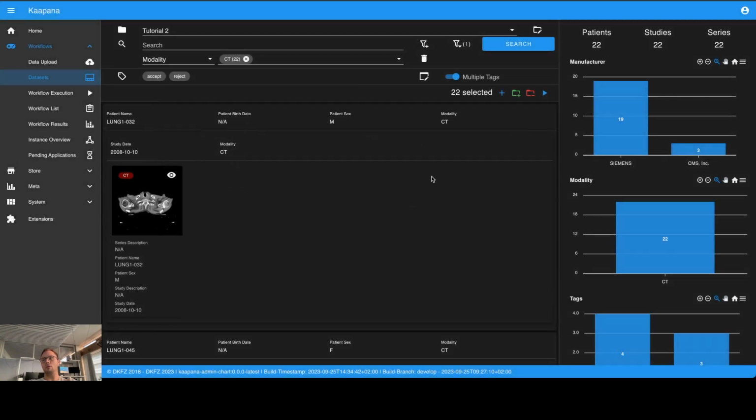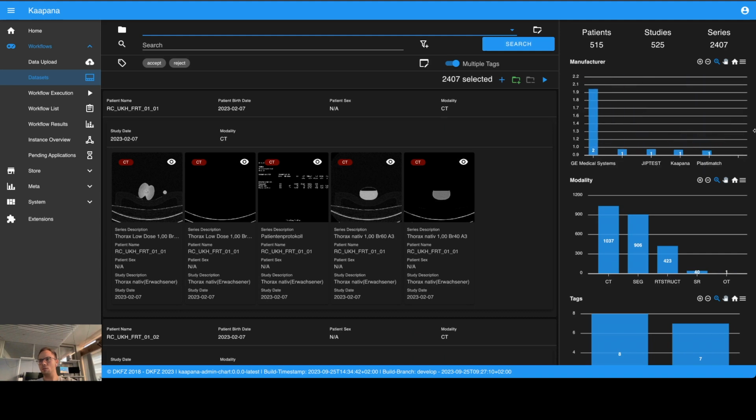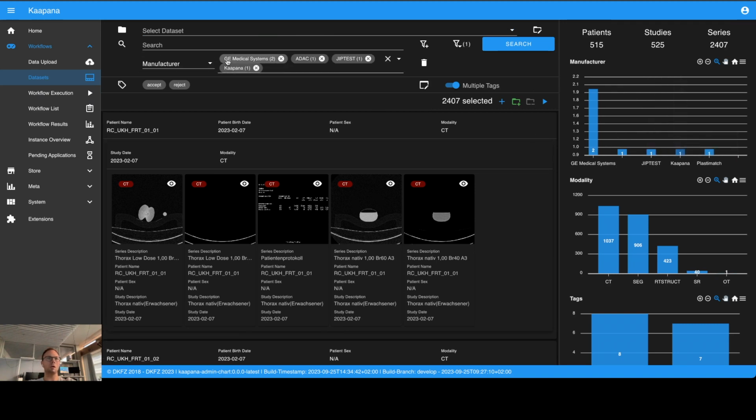And another thing I want to show is that here on the right side, let's actually go back to the original. You can also zoom in here, of course. I think I already showed this, that by just clicking on the columns, you set those tags. That's very convenient. And what you can also do is download the data as an SVG or a PNG, which is just a screenshot basically of the chart, but you can also download as a CSV, which is, for example, relevant if you want to go for a patient list. And I think that's pretty much what I wanted to show.